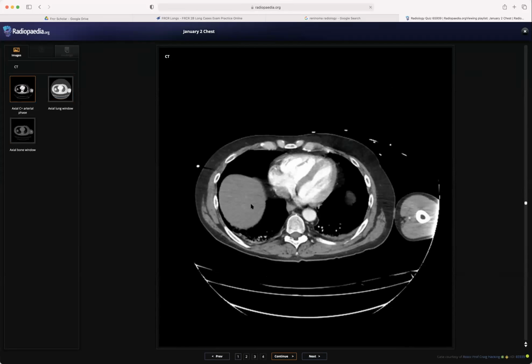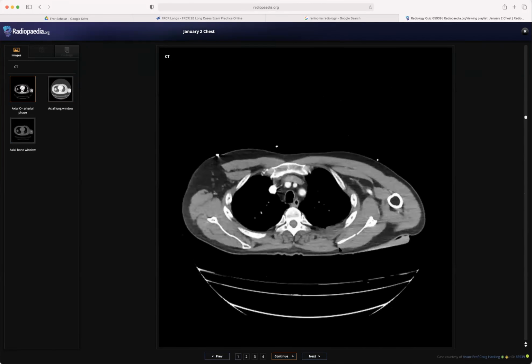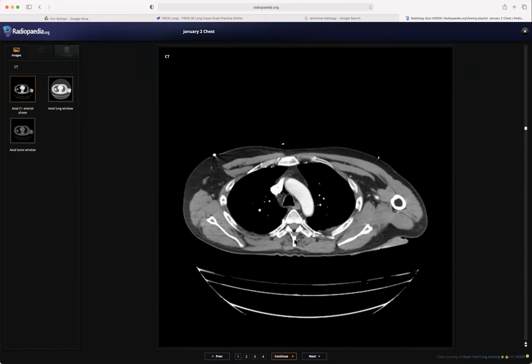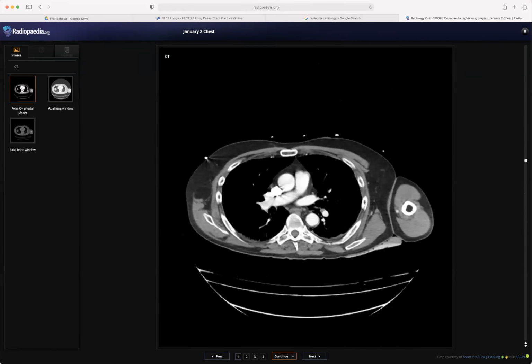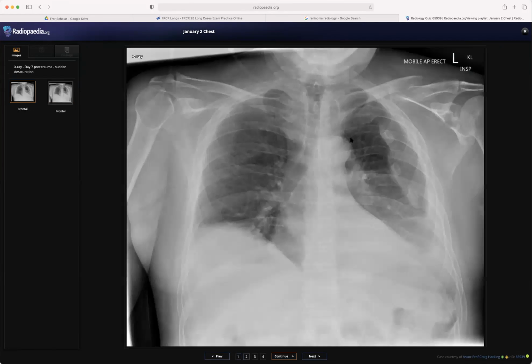Okay. And this patient is a trauma patient, and if you notice here during the CT chest, some problem happened. The first chest X-ray was not there, but the lungs were both almost equally ventilated, so they are of equal volume. But here the left lung is significantly reduced. And you mentioned the flail chest in the first CT scan.